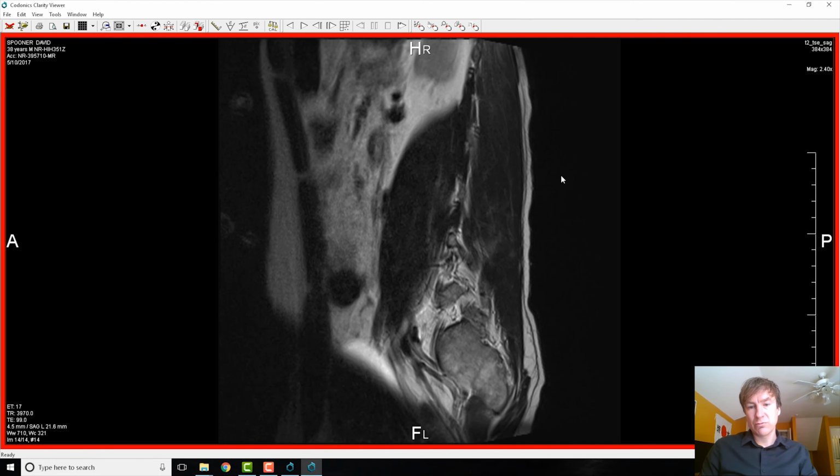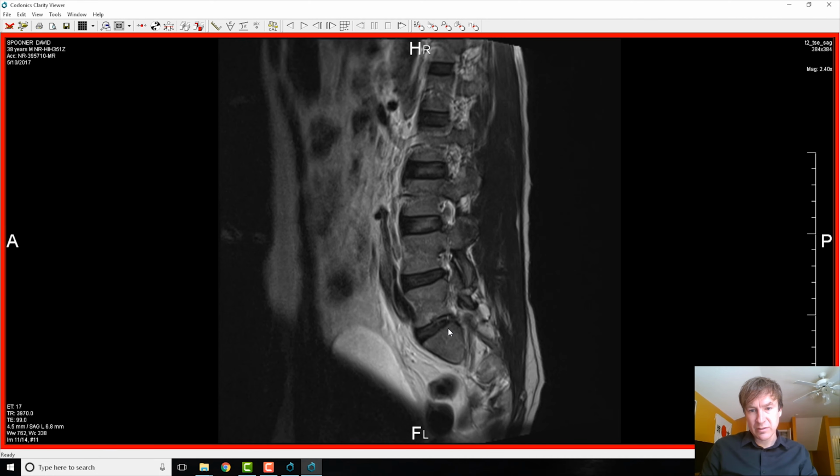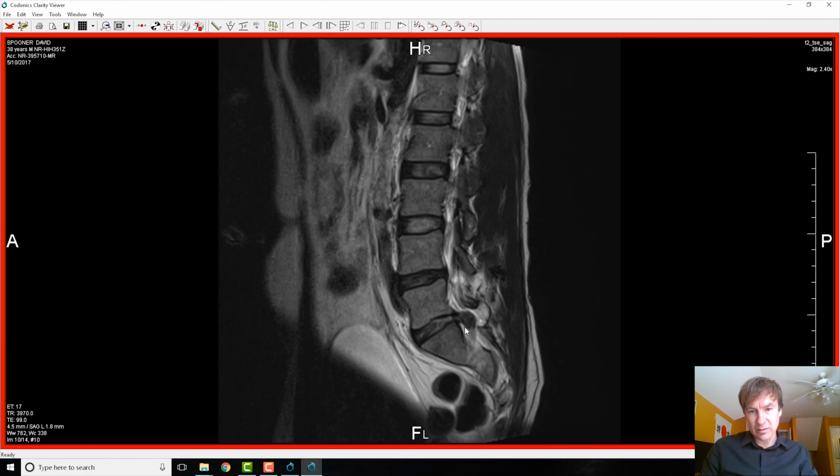So I just went from right side to left side. So I'm going to go left side, back to the right side. And we're looking at this L5S1 disc. And look at this here. Do you see how big that is? It's a massive herniation. Herniation means that the inside jelly material has found its way all the way out of the disc, the side wall here.